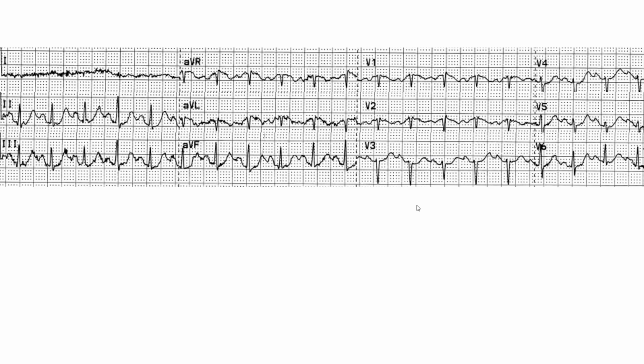The same way I explained the cardiomyopathy pattern where you have low voltage in the limb leads. At one stage, if you have a cardiomyopathy, especially ischemic cardiomyopathy with a lot of scar tissue, you can lose voltage everywhere. So you can have diffuse low voltage in end-stage cardiomyopathy awaiting transplant. So low voltage doesn't necessarily argue against anterior MI, but it makes you think, well, this could be COPD. Eventually, this patient, that's what she had. She had really advanced COPD with a normal EF.